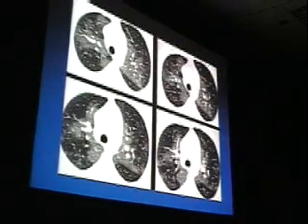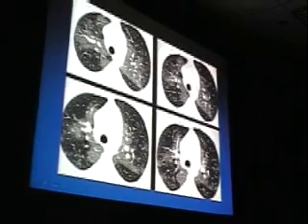At first glance, this patient looks like they have ground glass opacity, geographic. Notice it's relatively central in distribution. Notice, however, the marked disparity in size of lung vessels between the hyperattenuating and the hypoattenuating areas of lung. That is a clue that you're not dealing with ground glass opacity in the sense of an infiltrative lung disease, but that you're dealing with the phenomena related to differences in lung perfusion, or so-called mosaic perfusion pattern.